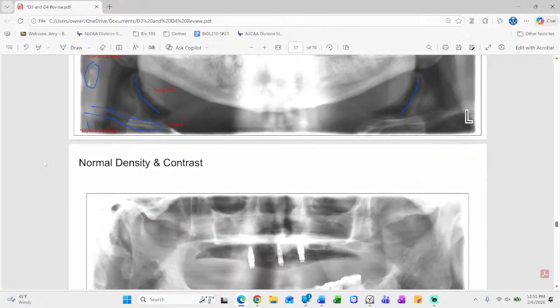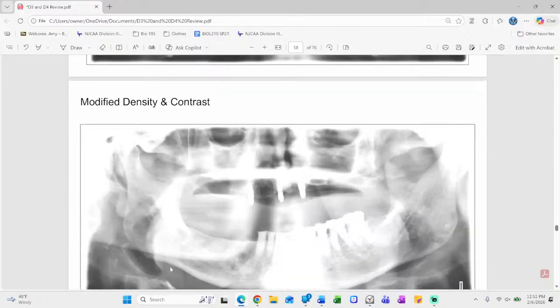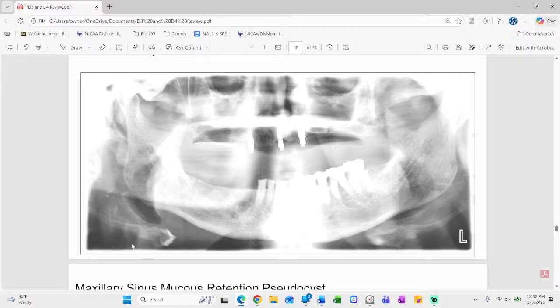All right, here was another. This one has the implants up here. Again, we're looking down at that corner, and I think I lightened this one also for you. Down here, here's my epiglottis. Oh, sorry, that's hyoid. It's really separated out. Arm of hyoid, body, arm. So you've got to find your two arms there. And then this is my thyroid. Oh, this is a different one.